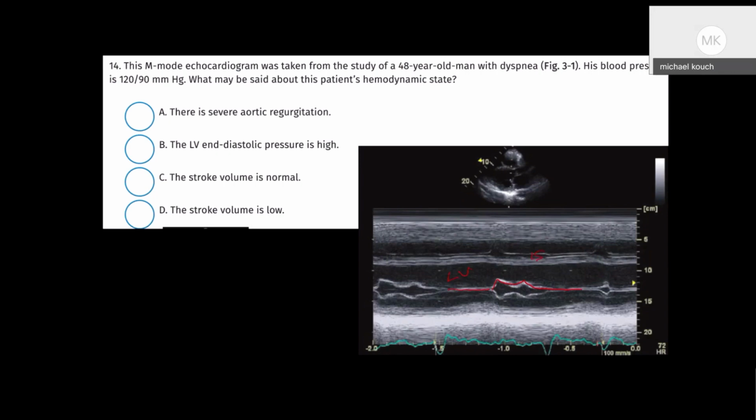And while there's not a great measurement here, this is maybe 11, and this is maybe 14-ish? So we have almost 3 centimeters here, right? So it's pretty big. Our E-septal separation is what, 7 millimeters usually? So we have a big separation between the E-wave of the opening of our mitral valve during diastole and where it hits the septum. Okay, so what would that tell you?